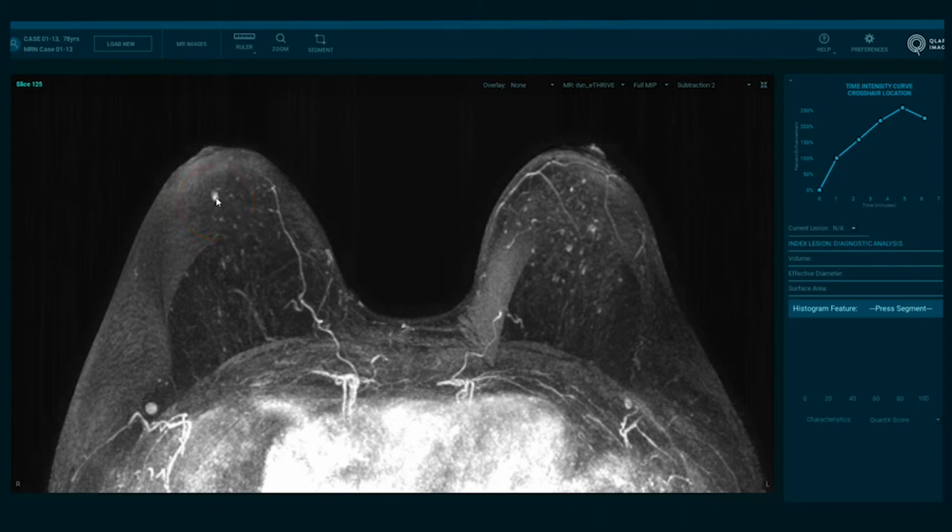It's actually smaller than 5 millimeters, quite obviously enhancing quite a lot. We have a good bolus of contrast. The technique of contrast injection is good, and we have some draining veins and contrast in the vessels, which will also allow a good technical bolus for us. We also have enhancing in both sides. We have the foci, enhancing foci, probably due to merely background parenchymal enhancement. So with the MIP image, we have a lesion in the subareolar region, which we need to evaluate further.